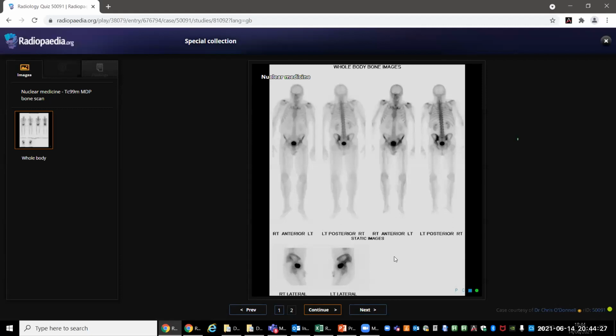I would ask the age of the patient, and I would be thinking about a degenerative arthropathy at these sites, and I do not see any focal intense uptake, which would make me suspicious for a metastatic lesion secondary to prostate cancer. So what do you think is going on here? I believe these are degenerative changes. For further evaluation, I would do an X-ray pelvis to see the SI joints and to be sure that these are only sacroiliitis and not a metastatic process involved in the sacrum.